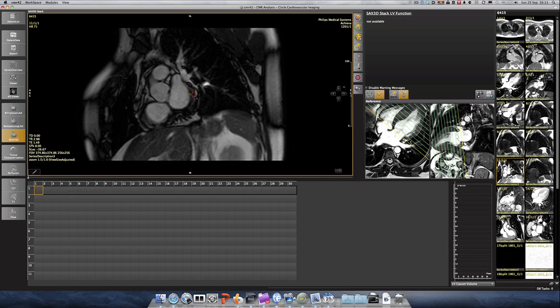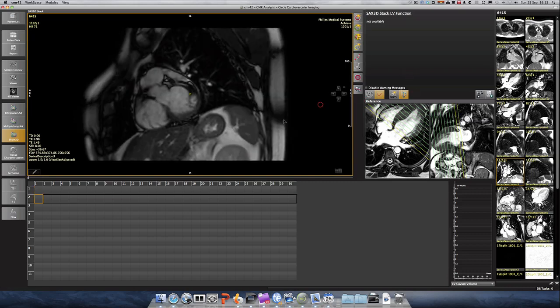This has to be the left atrium. It's very thin-walled. This has to be the right atrium, very thin-walled interatrial septum. One slice further down, you start getting a little bit of muscle in there, but that still looks very much like the left atrium, aortic valve, so that I wouldn't include for the LV. The RV, sometimes you have bits that you can include already at that level. So here, this looks like we're very close to the pulmonary valve. This may be part of the RVOT, but given that it's so small, I probably would ignore that and say, nope, there's no RV yet.